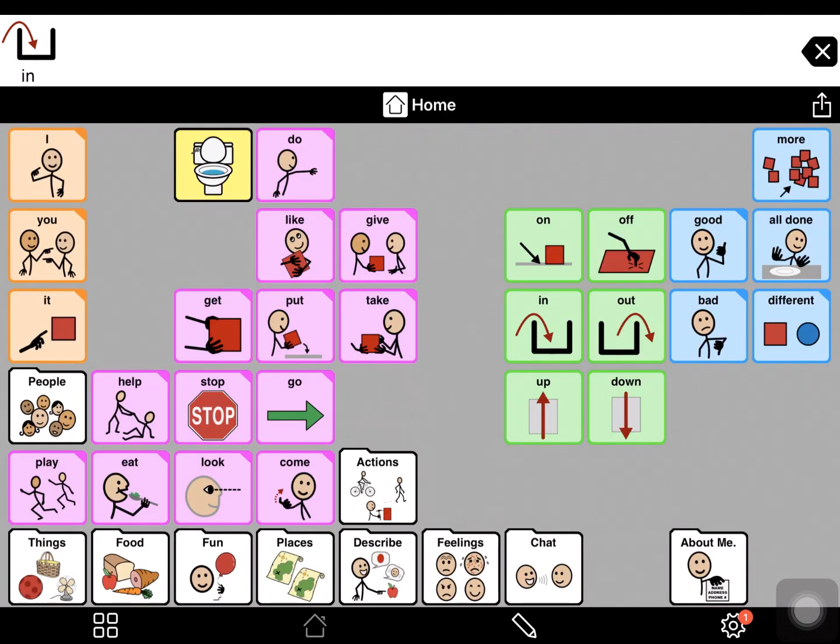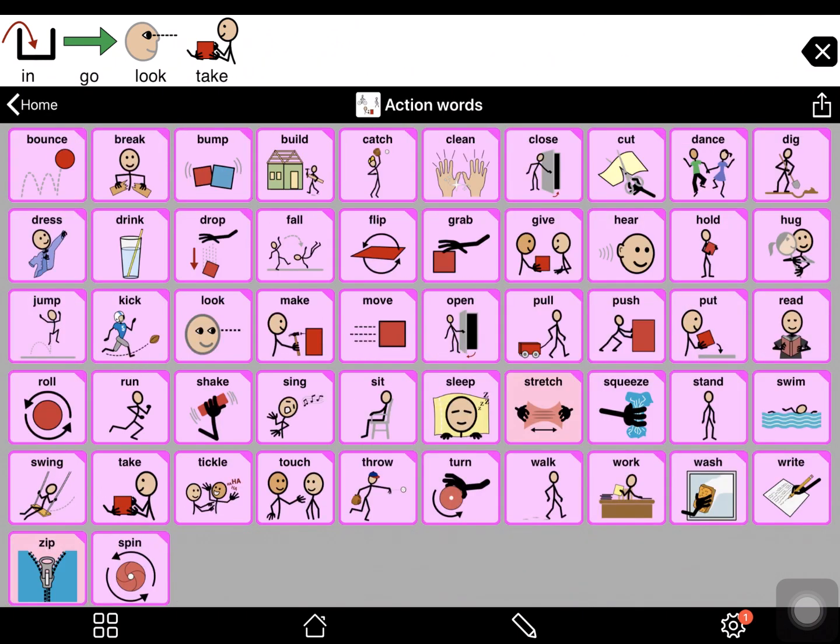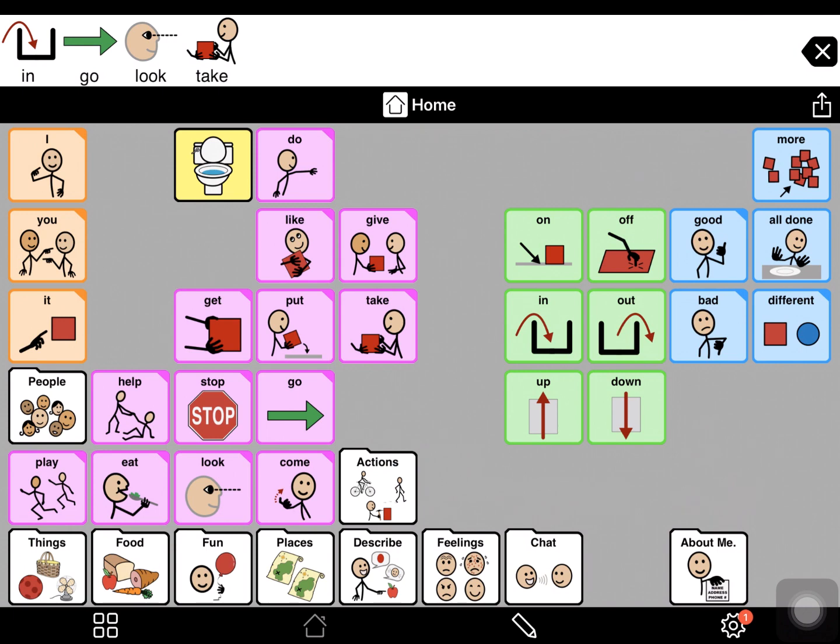One downfall is if you have grammar selection on, there's a very close difference between holding and selecting if you're holding it too long. But you can see it gives a little bit more visual feedback for that communication partner to see where you're navigating. And it doesn't affect the access too much.